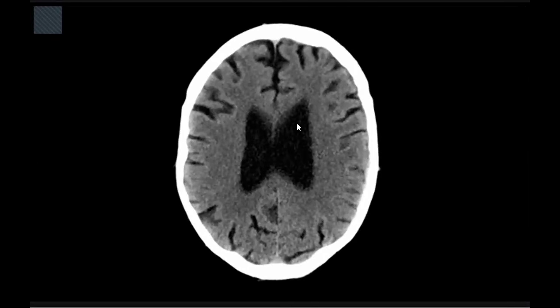In my daily practice, I want to check bone window to see if any related bone fracture. Okay. I want to tell you another thing. If you ask for another sequence or another window and you lost the finding in the main window, you will lose so many marks from your observation. Okay.